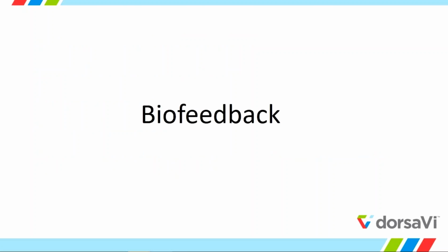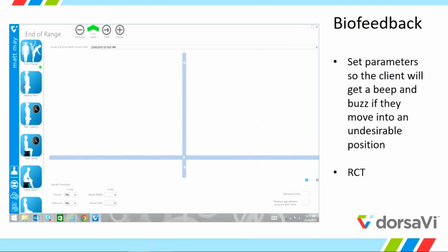So that was live training. Biofeedback is the next application that I wanted to talk about. This is where you're actually going to send the RFD with the client, just like the monitoring session, but you're going to set parameters before they go. So let's say you don't want them to move out more than 40% of their max flexion throughout the day.